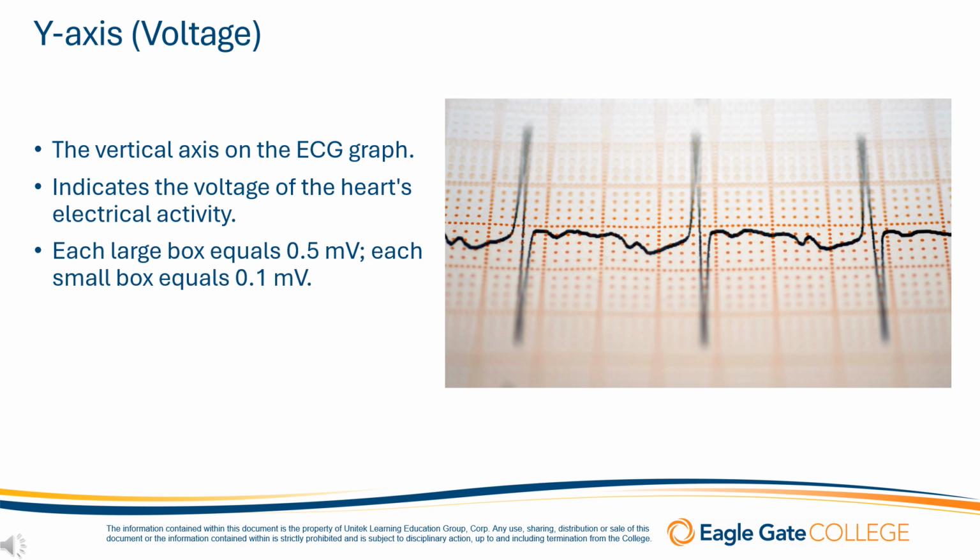When we record an ECG, we are capturing the electrical activity that triggers heartbeats. These electrical signals are generated by the movement of ions across the cell membranes in the heart. The different waves and complexes that appear on the ECG tracing, such as P waves, QRS complexes, and T waves, correspond to the depolarization and repolarization of the atria and ventricles. These electrical events create changes in voltage, which the ECG graph captures and displays.